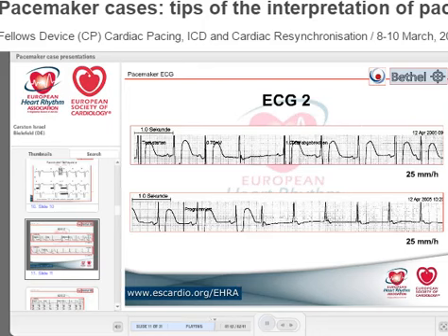The pacemaker has been inside already half a year. No lead dislodgement. Wonderful. Crosstalk. This is the real good old crosstalk. It is clear whenever the atrium is not paced, the ventricle gets its nice ventricular pace. As soon as the atrium is paced, there is no more ventricular pacing.